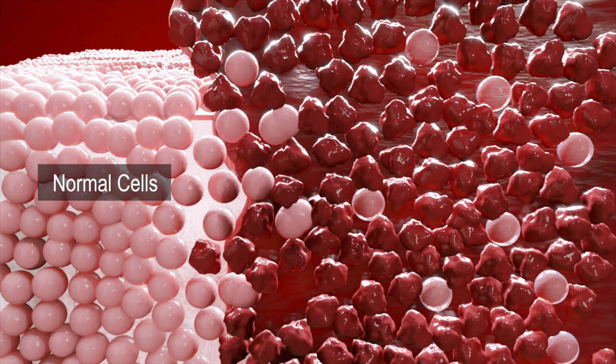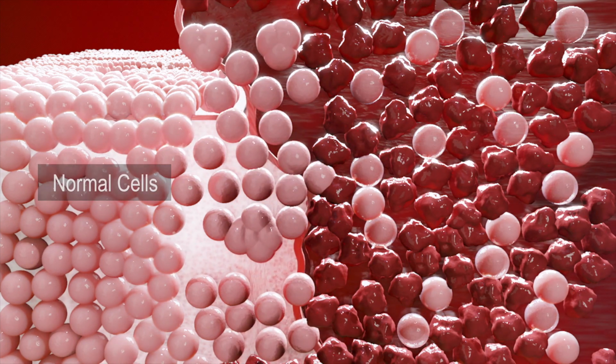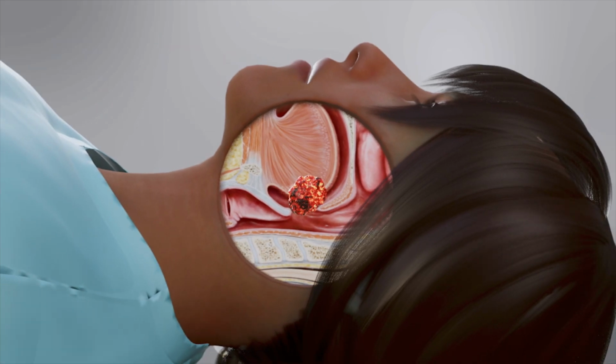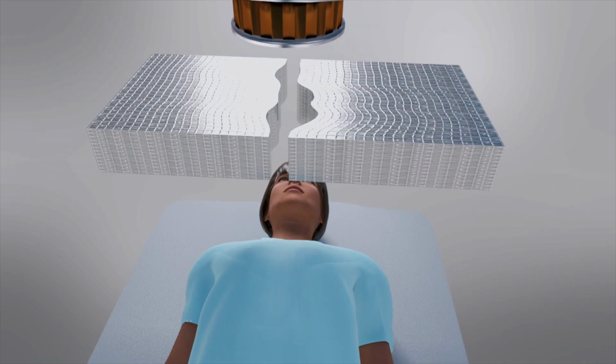As the tumor cells are killed off in greater numbers by radiation exposure, the tumor both shrinks in size and allows for normal healthy cell repopulation. In addition to this, a beam of radiation can be aimed at the target of interest.